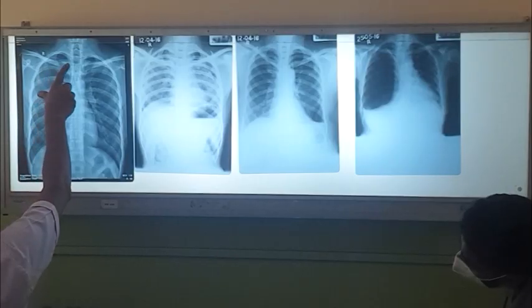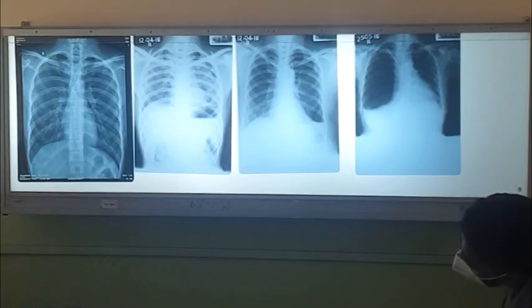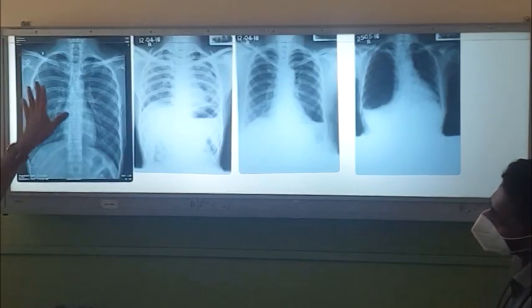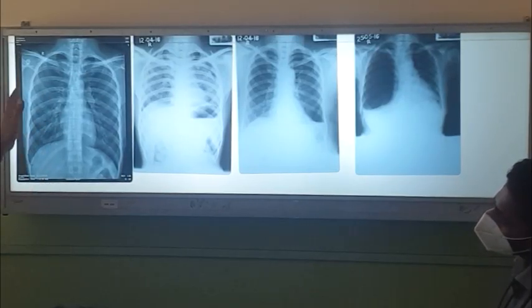So this is a margin. So this is a small pneumothorax. And if you miss it and send the patient home and something happens on the way, and the patient is going to die, then you will be caught because you have done the X-ray and you have not detected. So it's like negligence. Okay, so don't miss pneumothorax. You have to look for pneumothorax, otherwise you are going to miss. Right? This can be missed very easily.